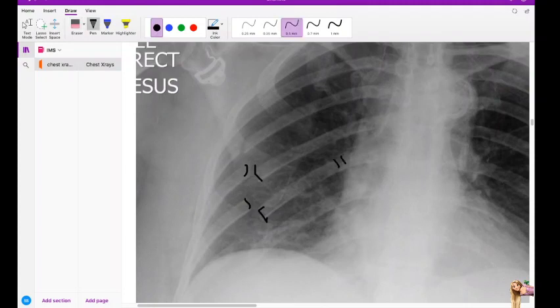Then there's one over here. I'm not sure then. I thought it was okay. This one, this one, this is broken. I think over here.